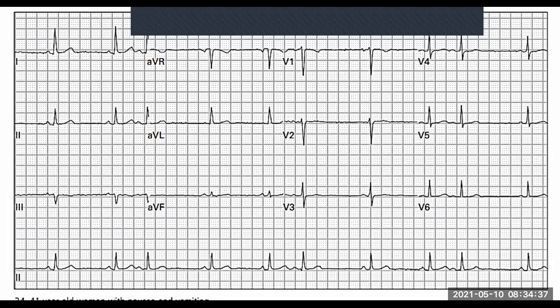It will pump normally and it will give its signal off normally. Then it's taking a bit more time. Then it's giving a bit of a short time. So we can see there is something wrong. So even if you don't know what's going on, immediately this should ring some alarm bells because this woman is having nausea and vomiting. So what could be going on?